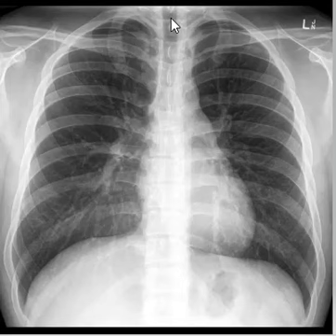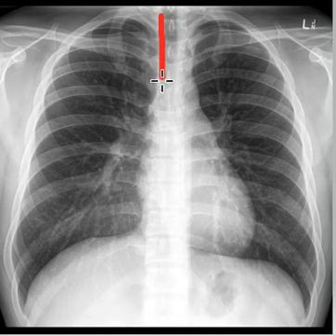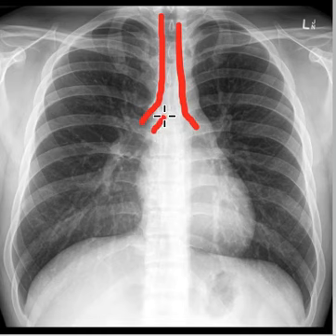Now the chest X-ray is very important when it comes to CHF. In order to understand the abnormal X-rays seen in CHF, we need to know what the normal chest X-ray looks like. So right in the center we have the trachea, and the trachea bifurcates, and the point where it bifurcates is known as the carina.